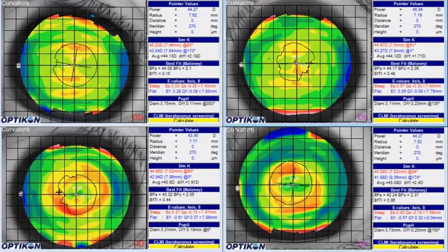I would make that decision hinge on whether or not you feel the patient would be comfortable in corneal sclerals, and then also any fluorescein information you might have with observation of the lens on the eye. So hopefully that helps. I think we can keep the topo demand the same. This looks like it's under correction due to fit of the lens as opposed to topo demand. So hopefully that's helpful.